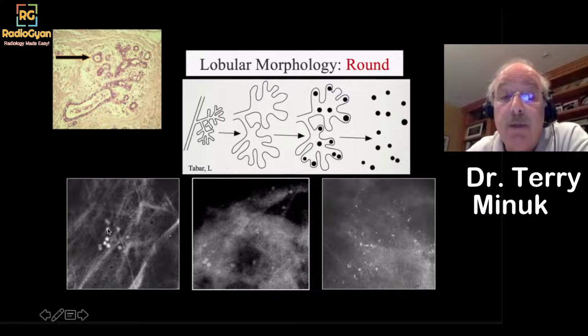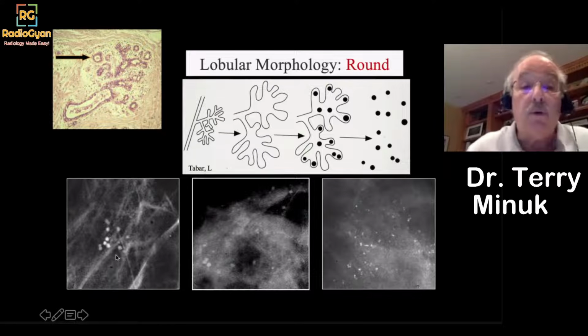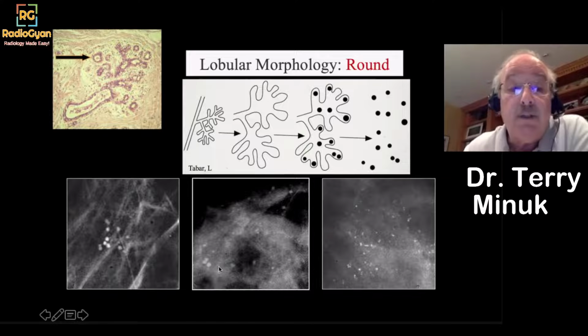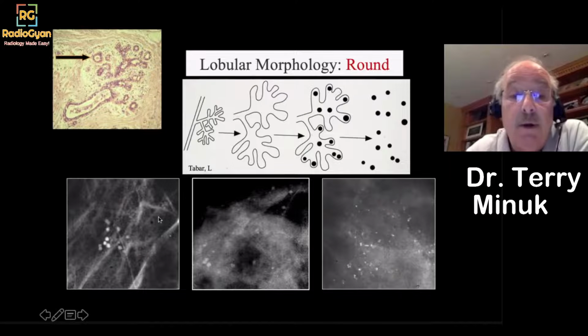And that's what the picture on the right is. They're involutional calcifications. A few years ago, they were probably layering out in fluid in the acini. Now the acini have atrophied, and you're just left with the calcifications. Beside it are similar round calcifications, but they're probably still floating around in fluid if you did a lateral view.